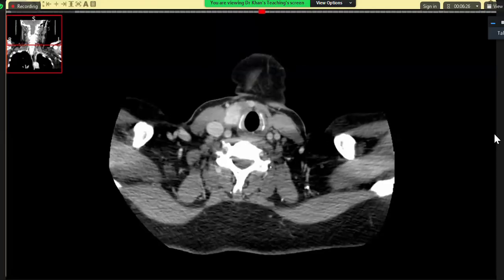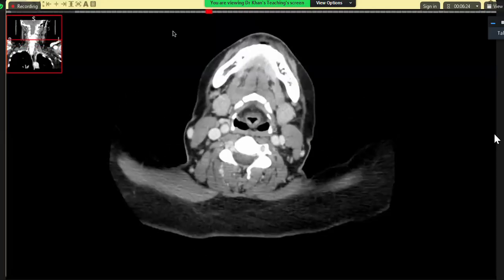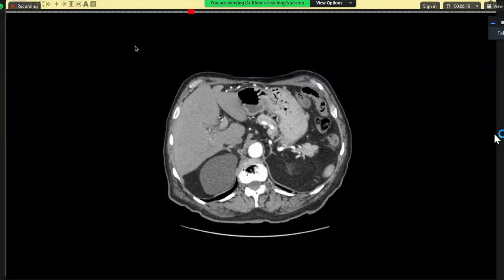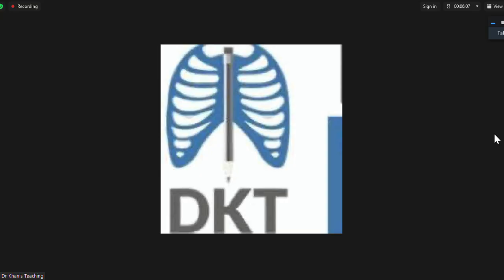Okay, last case of the day. So, madam, this is a 72-year-old male, pain epigastrium off and on since 2 years. The patient came to A&E. The surgeon wanted us to rule out mesenteric ischemia particularly. So we did a CT scan.